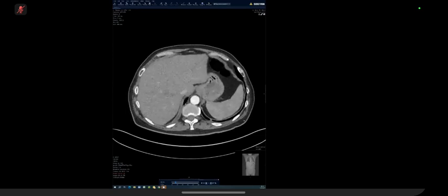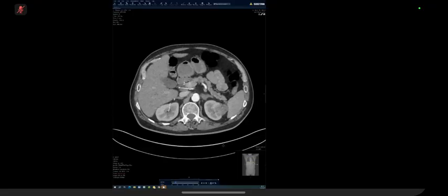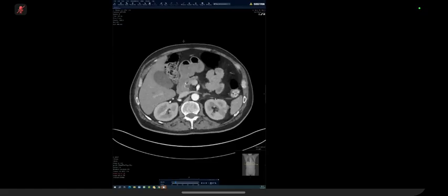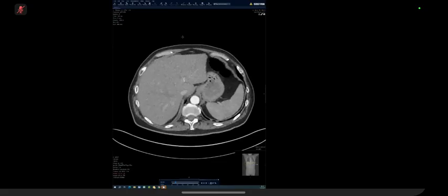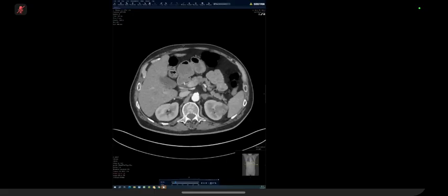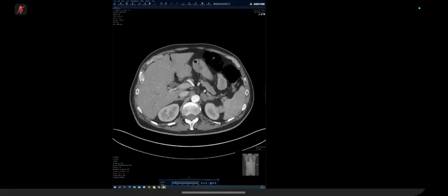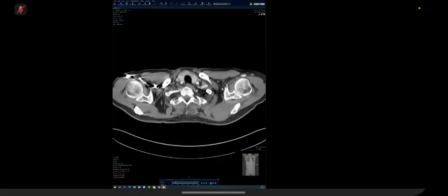In the left kidney, there is an enhancing mass, and I would like to review it better. Yeah, so there is an enhancing mass, and it has sort of a central enhancement. I'm suspecting an RCC in this instance. Normally, I would look to see if there's any adjacent lymph nodes, and I would check to see if there's involvement of Gerota's fascia, as that would change the classification. I would look for other lesions, and I would interrogate this in a coronal view. And apart from that, if I'm only given this and there's no abdominal imaging, this is as far as I can take this image.